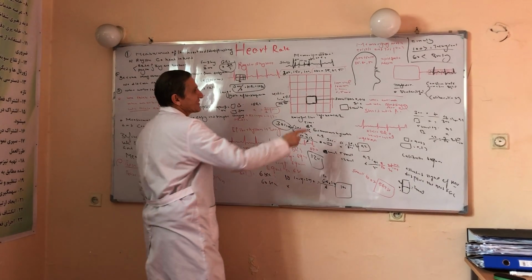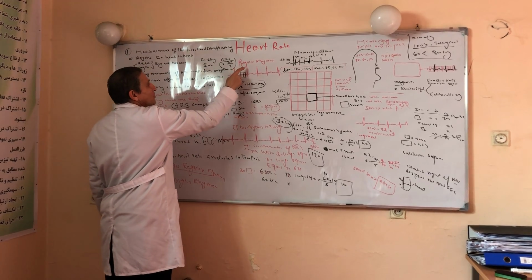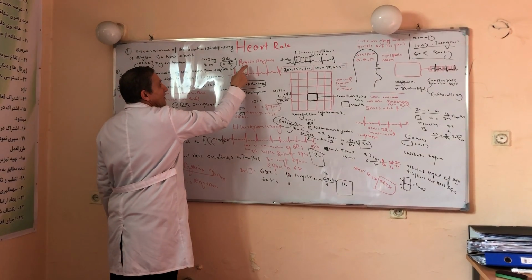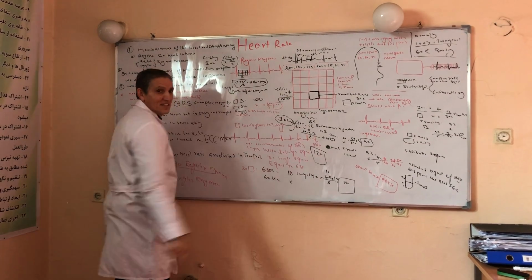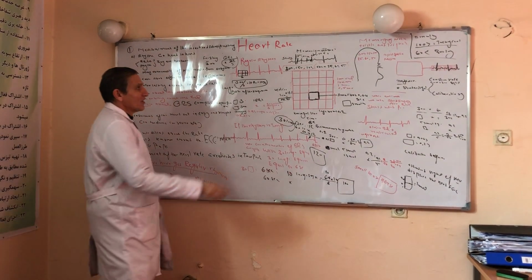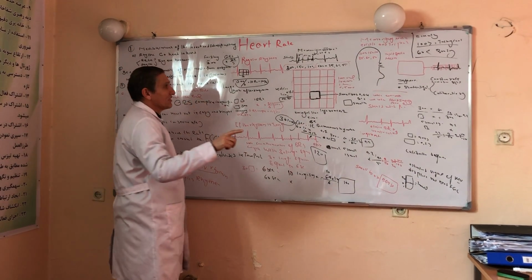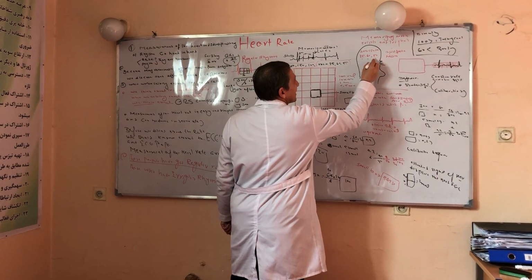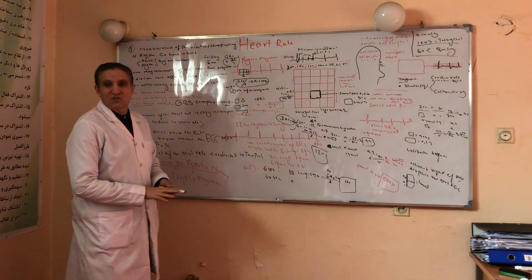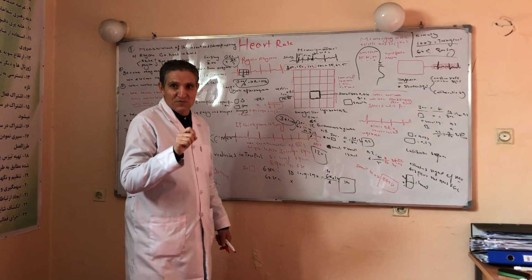In this case, this is the start line, which we omit, and we start from the next line: first 300, 150, and 100. This is a rapid method. If there is a bradycardia, another triple is added: 75, 60, and 50. So the rapid method is 300, 150, 100, 75, 60, and 50 beats.